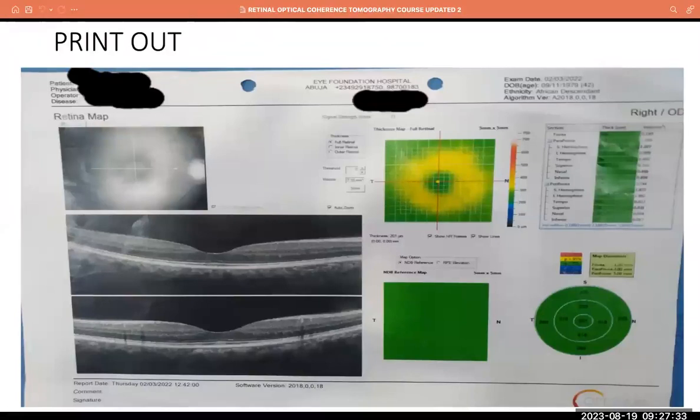That is gotten by telling the patient where to look in the machine. If you've done an OCT yourself, when you're looking into the machine, for the macular images, there will be a light, and you are told, look at this light straight ahead. So the technician makes sure that the light is directly on the fovea. The two lines intersect on the fovea before the image capture is done. So that's also one of the things you should look out for.